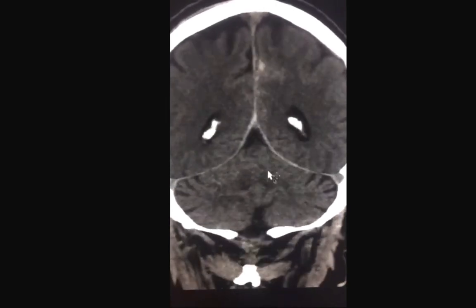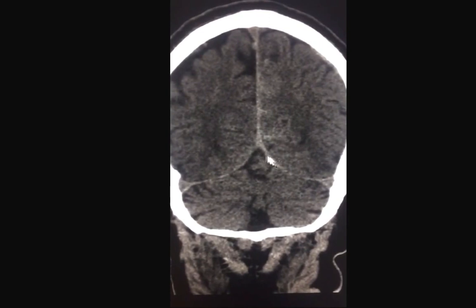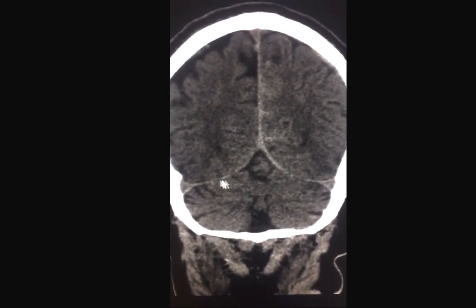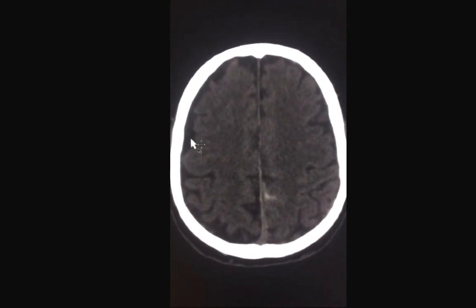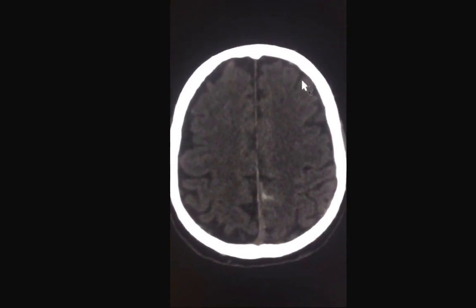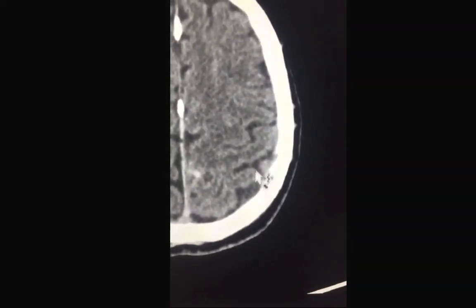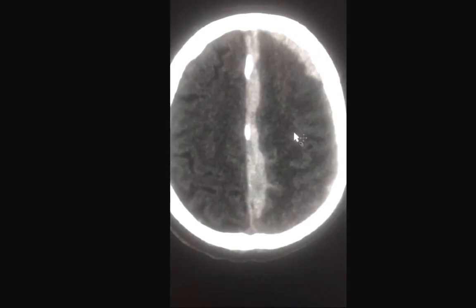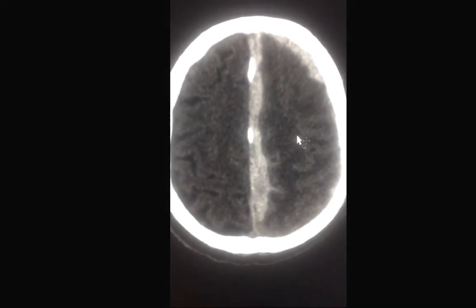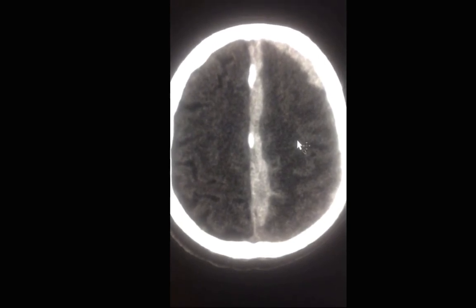A practical way to do that is to look at the coronal image, where asymmetric thickening of the falx or unilateral thickening of the tentorium is easier to appreciate. Also, make sure to be very careful when assessing the edge of the brain. Make sure that the CSF spaces are dark and clean. The adjacent dense bone may obscure underlying minimal amounts of bleeding, so change the window to have a better ability in detecting these abnormalities. If in doubt, calling the abnormality along with clinical observation and a follow-up CT scan is a reasonable way to go.